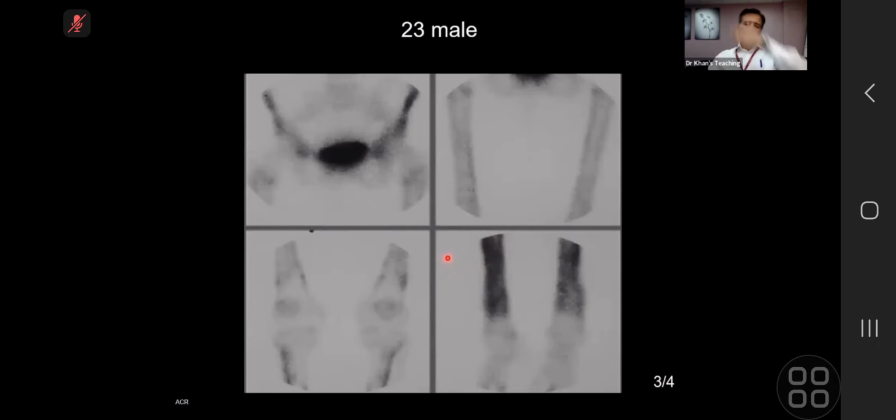I don't know much about nuclear medicine, so we have got a separate course on nuclear medicine. And please remember that HOA has come in the exam as a nuclear medicine case, and this is where they start. Your eyes have to be developed to pick up periosteal reaction. You see something like this on a nuclear scan, and the key thing will be that you will ask that you want to see a plain film. This is what they are looking for. So nuclear scan for HOA is very important.